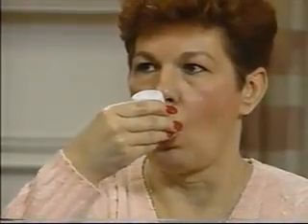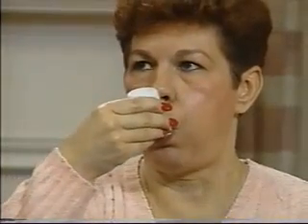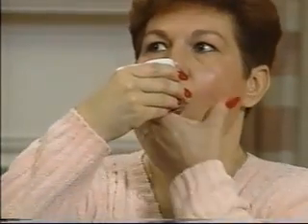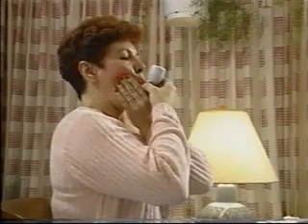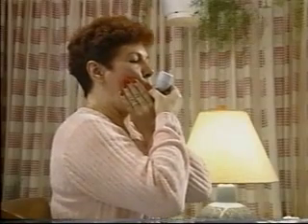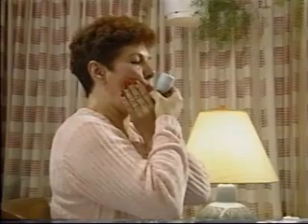While performing flutter therapy, it is important to keep your cheeks as stiff as possible, since the vibrations produced by the flutter are wasted when they are used up in your cheeks. Look into a mirror, or hold your cheeks flat with your other hand to help keep your cheeks stiff.